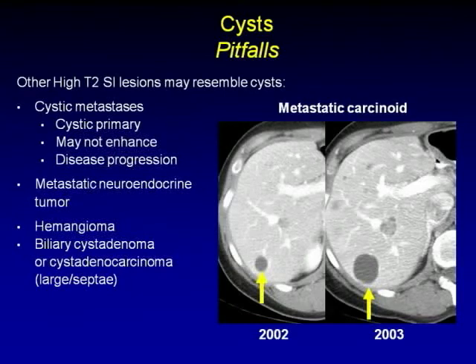Usually in this situation with very vascular tumors, as they grow, they can outstrip their blood supply and undergo necrotic change and cystic change, and you often see the enhancement around. But remember, there can be instances where they look very much like cysts. Or if you go back to this lesion, if you look very, very carefully at the periphery, you might get a hint. There's a little bit of enhancement around there.